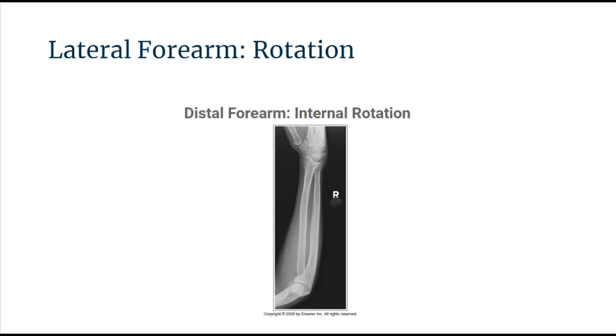In this projection, you can see that the distal radius is demonstrated anterior to the ulna. Anytime that occurs, you should know that you are in internal rotation.